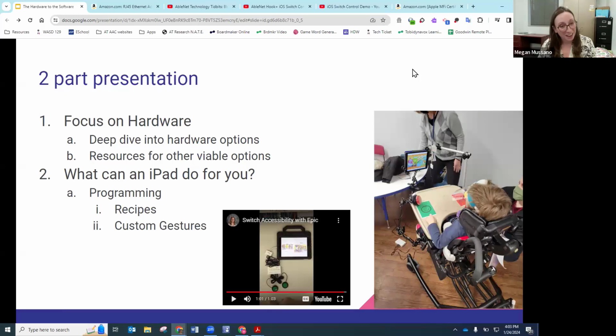So in order to make that happen, there definitely is some background programming. But when it comes to implementation for the parents at home or the teachers in the classroom, all they have to do, like I said, is the triple click and the functionality is there. So I'll teach you all the programming behind that once we get switches hooked up, and some even more intense programming. That is just kind of a taste of what we're actually working for here.